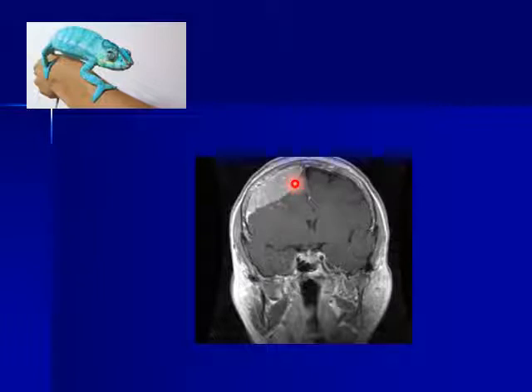So, it is wise, if a patient with a known malignancy, such as cancer breast or something, and you see a meningioma-like lesion, don't be so confident to tell that it is a meningioma. Put in mind, it could represent a dural metastatic lesion.